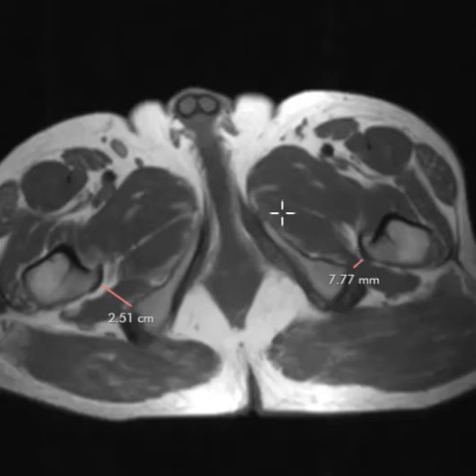1 centimeter. So the muscle that comes through here, called the quadratus femoris muscle, gets pinched when this space is too narrow. And when it gets pinched, this muscle can become edematous or become atrophic. Sometimes it can even bleed. So this is what we call ischiofemoral impingement, where these two bones are too close.